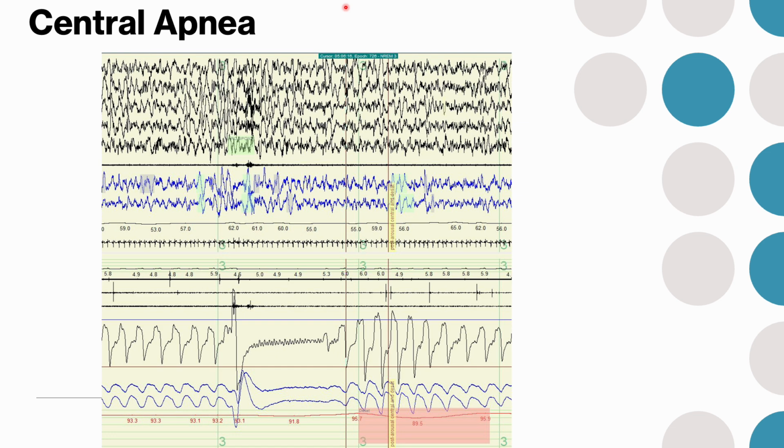You've got both sides. And a lot of times these are happening after an arousal. So you have to have 10 seconds of sleep, which, that's very close to 10 seconds. When unsure, go ahead and score the event, even if the physician doesn't think it's a real event. It could provide a high enough AHI for the doctor to at least have diagnosis options in case the patient does have real apnea.